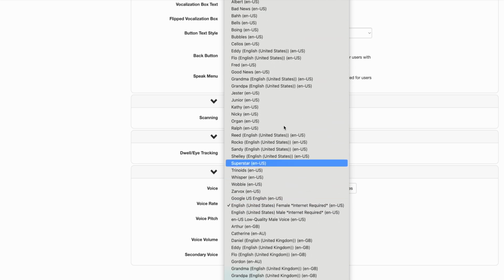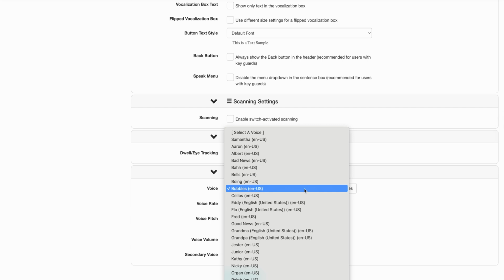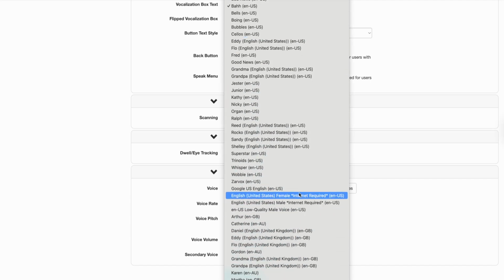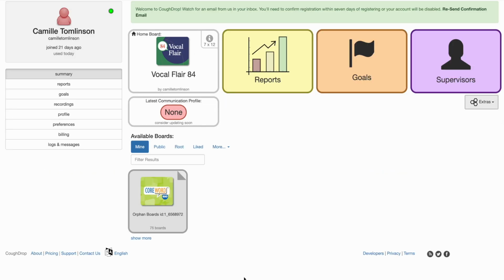And some of them are pretty silly, like Bubbles. Do you like my voice? This is how I sound. I don't know why you would choose that, but a little kid might. Or Ba. Do you like my voice? This is how I sound. But I think for me, I like this one the best. Do you like my voice? This is how I sound. And I will just save my preferences.